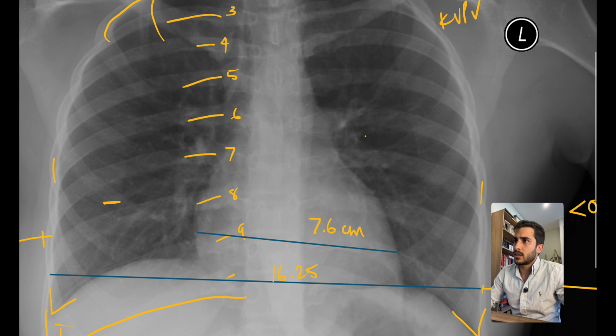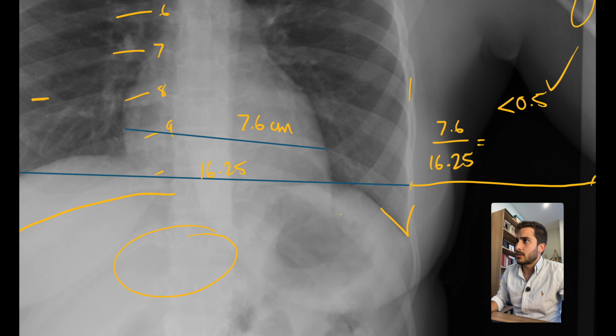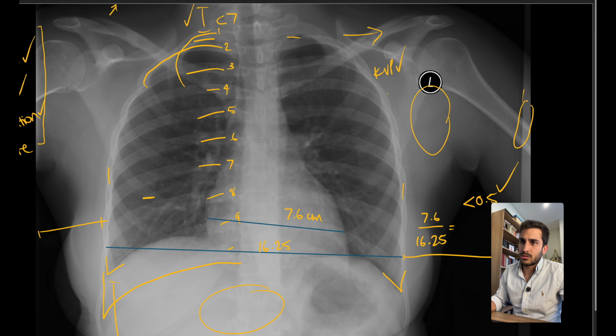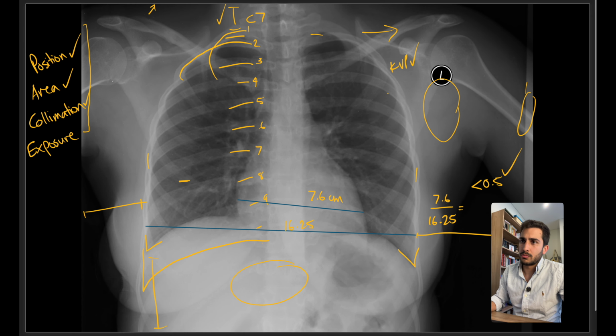Now, it's a different story if you see a lot of graininess in the abdomen area, or maybe in the sort of the shoulder area over here. So that's not too big of an issue. So exposure seems to be adequate for this patient.